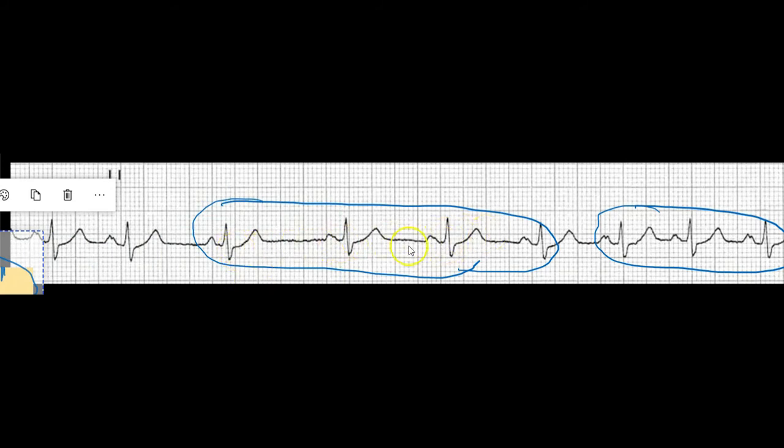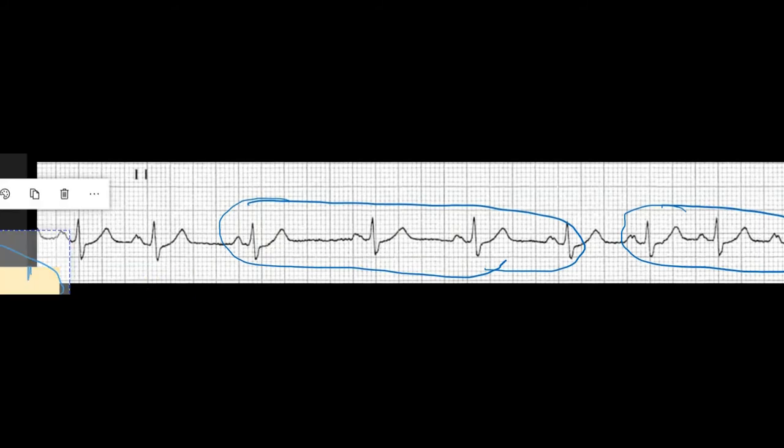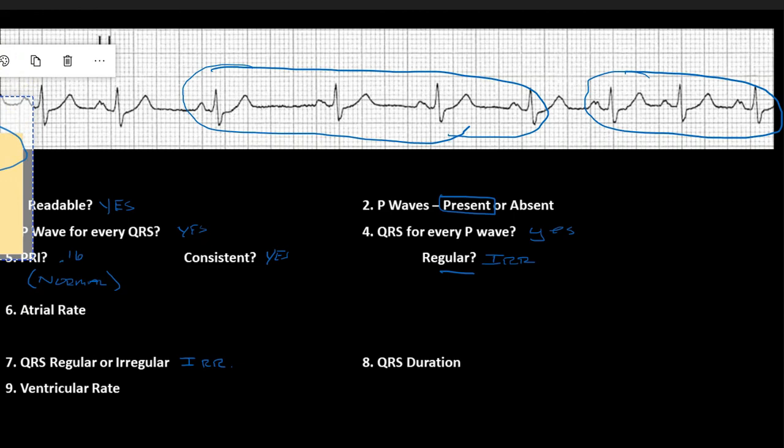And these appear to be in order as well. A little irregular from these three to this one. So I bet you we could take this one. I can see the way that it is actually sitting there right now. Could probably cause a little bit of an issue for us, but that is following a pattern. Okay? So that's following a pattern.